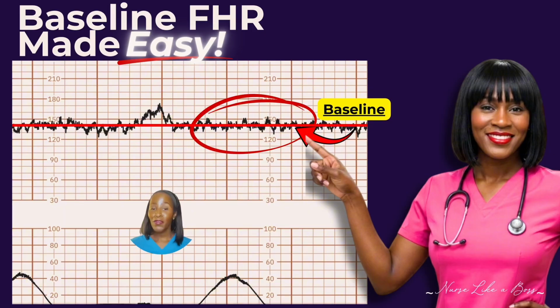Made easy. If you're a nursing student or you're new to labor and delivery, one of the first things you need to learn is how to interpret a fetal heart rate tracing. And we do this by starting with the baseline. The baseline is the very first thing that the nurse looks for when she's assessing a fetal heart rate tracing.